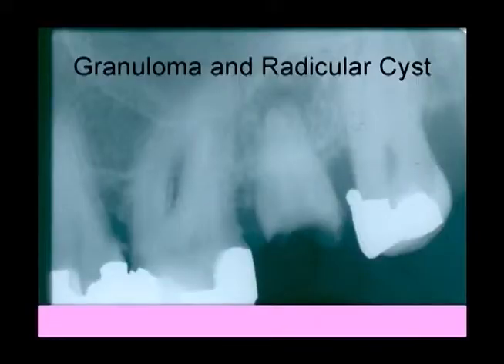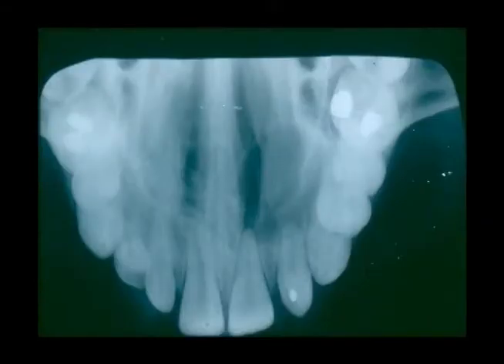If the inflammation continues in a chronic nature, two subsequent occurrences may be observed. The first being, and we can see it on this radiograph, the gross caries in the area of 2-7 and the apex of the root, where we have rarefying osteitis. This would be considered to be chronic, long-standing, and this may well be filling now, not with exudate, but maybe with granulation tissue from a long-standing attempt to repair the injury.